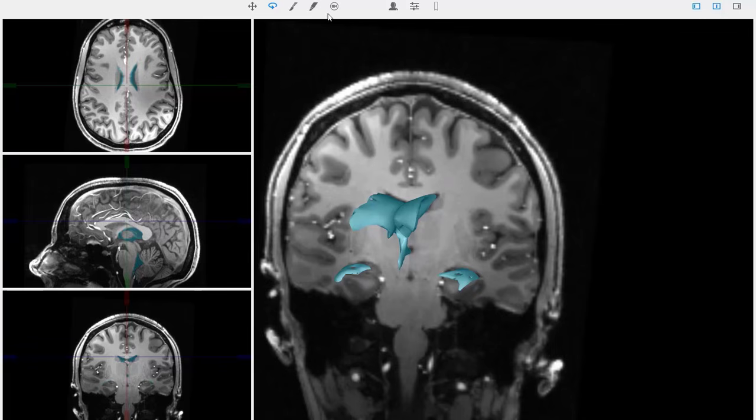Now one of the areas that students often confuse is the thalamus with the hypothalamus. We'll add the hypothalamus here in yellow. And the hypothalamus is a relatively small structure that has an incredible number of important roles for survival. Survival of the species, such as mating, and survival of the individual, such as the fight-flight response.